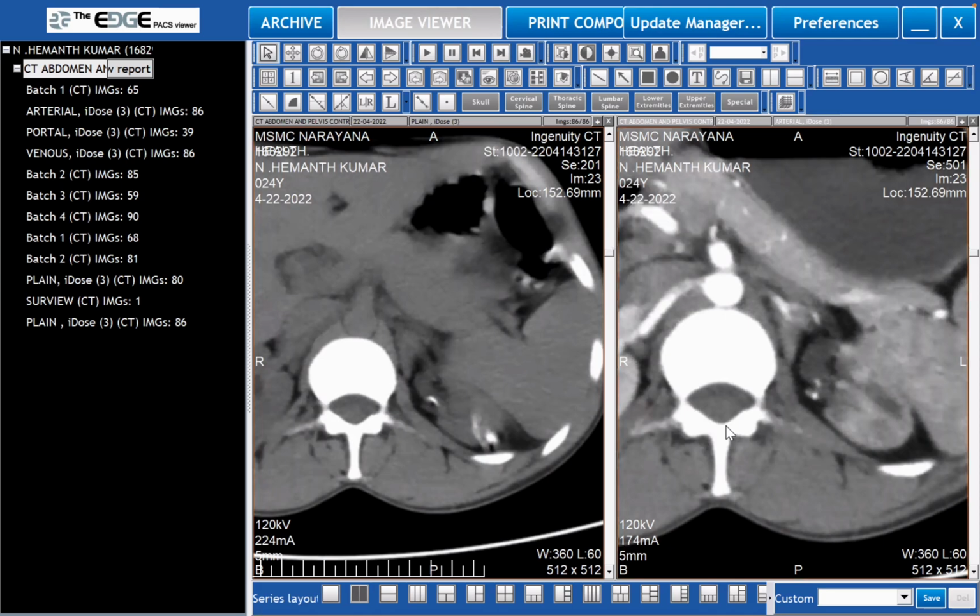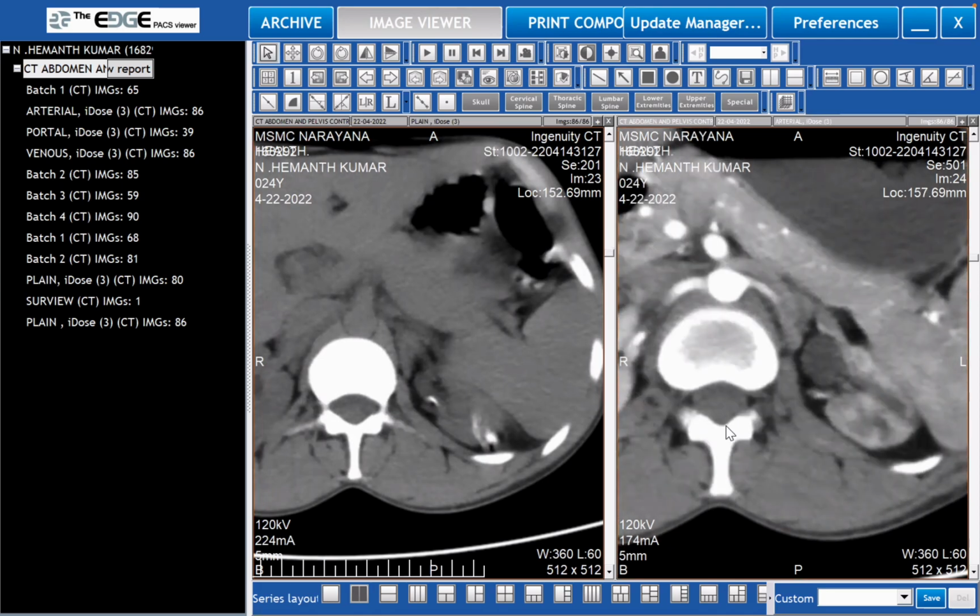We continue showing the region of that vein. The same patient we had seen. Renal artery, sir. When you see something like that coming into the hilum, and it's in this phase of the CT, it has to be either the main artery or a branch of the artery. Yes, sir. If it is the main renal artery, then if you look at that, you are worried. It is looking like one scraggly little piece of string there. It looks very thin.